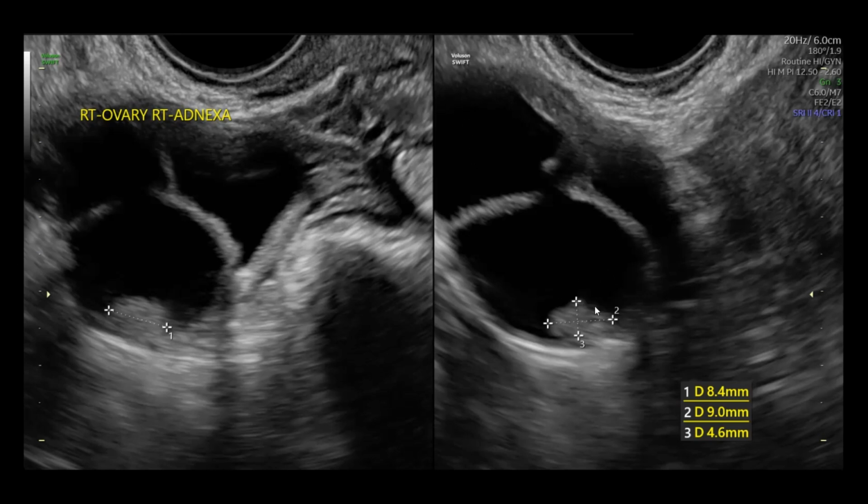The largest dimension of a papillary projection is key for the ADNEX model. The presence or absence of acoustic shadowing is key for the ADNEX model. The overall size and the number of locules are key as well. There are a few other aspects of ADNEX that are clinical in nature that can be plugged into the equation. Right now, the ADNEX model is going through some evaluation in Europe as a medical device. You can download the app, and there is an alternative website to consider using, which is the Evidencio website.